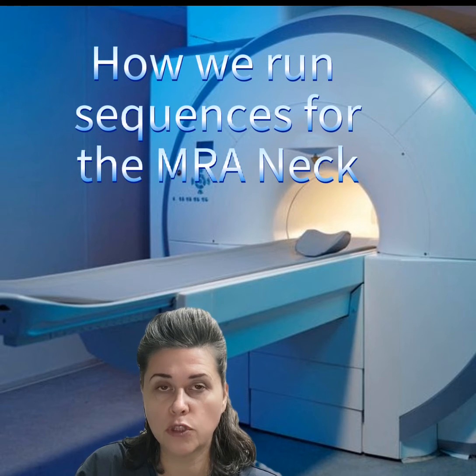For the coronal soft tissue neck slice angulation, we are going to use the sagittal plane, and we are going to draw the parallel line to the spine. Field of view will include the frontal sinus below the aortic arch. We are going to be covering the nose on one side, and on the other side the spinous processes of both C and T spine again.